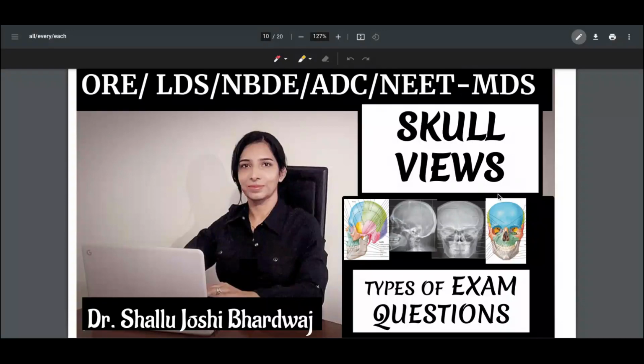Today, I'll be talking about the skull views, the lateral one. I'll tell you which structures are there and how to identify them in the radiographs as well. Okay. In the end, I'll be telling you what kind of questions you should expect in the ORE exam. So, grab your cup of coffee, sit tight, watch till the end.